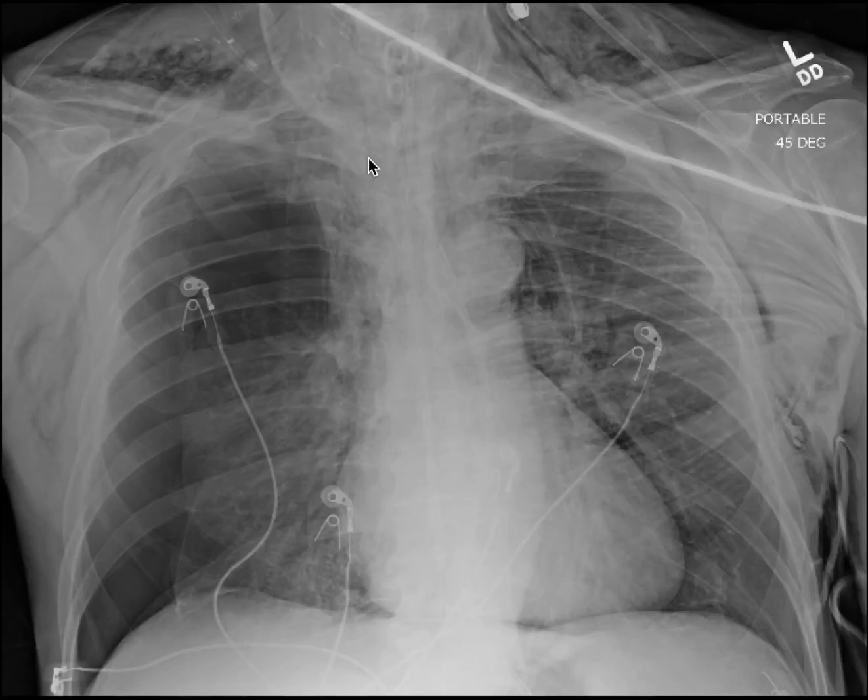Now, prior to this film being shot, the maneuvers that were performed were excellent. Here's what you have to do, and this was done. You must supply oxygen both over the mouth and over the tracheostomy tube, and that was done here. It looks like there is a non-rebreather over the mouth. This is the tubing from that, and this corrugated tubing you see coming down on this side is oxygen over the tracheostomy tube.